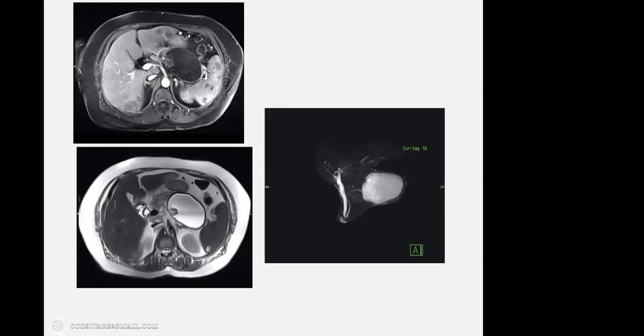Anything in the spleen here? Yeah, so there are multiple lesions in the spleen, but as I told in that earlier CT scan image, to diagnose a lesion in the spleen, you need to see different post-contrast sequences. Here the aorta is containing contrast and is very bright.